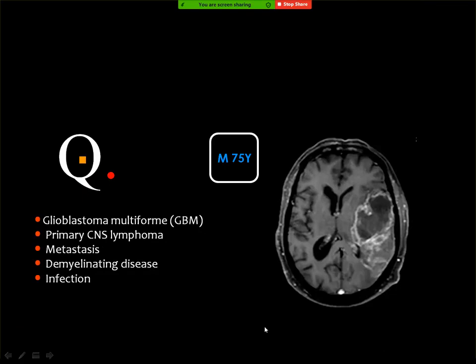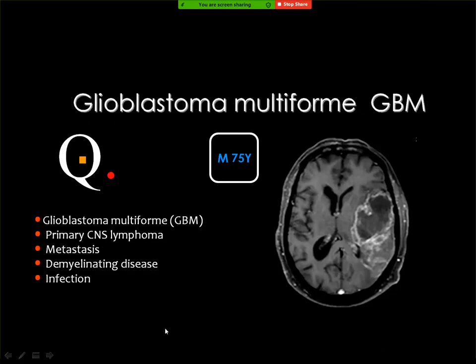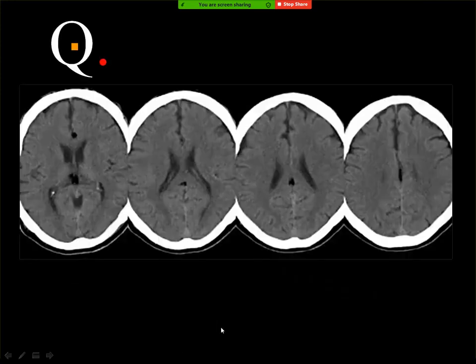Glioblastoma multiforme. It's irregular growth because of the enhancement and the mass effect. No, it's effacement of the white matter. Rupture of the dermoid cyst, I think. Dermoid cyst?